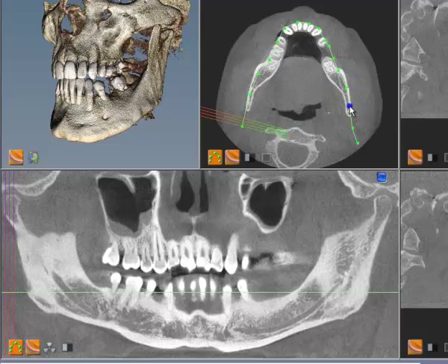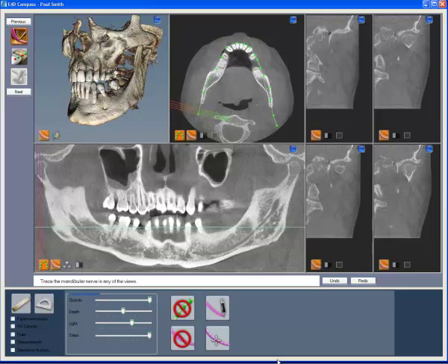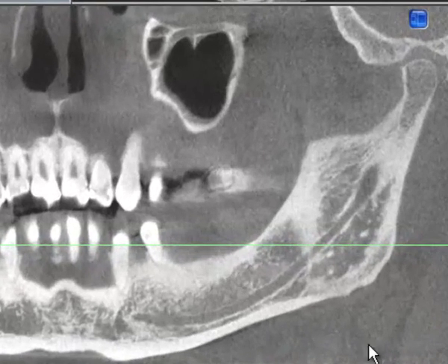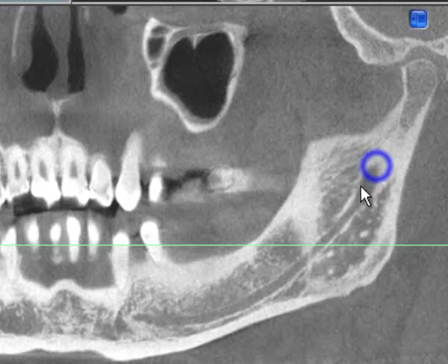It is typically necessary for demonstration to map the nerve beneath the implant area and the neighboring teeth. For this example, we are plotting the arch and showing the nerve canal for the entire left side of the jaw. The mapping of the nerve canal is linear, so you want to start at one end of the canal, usually towards the posterior. In the panoramic view, left-click in the posterior end of the nerve canal. The first click does not show a visual sign that you have clicked there. Move the mouse towards the anterior and left-click in the canal again.